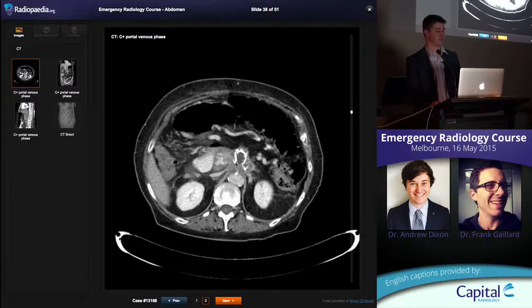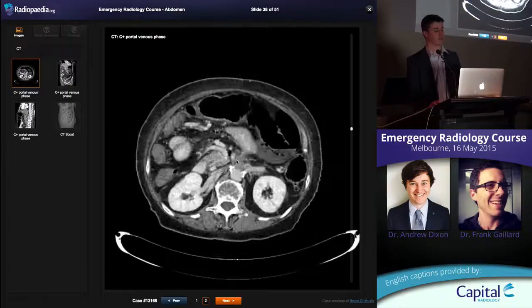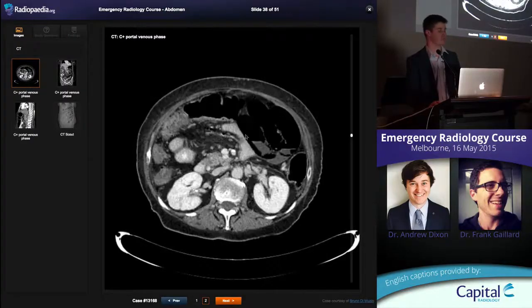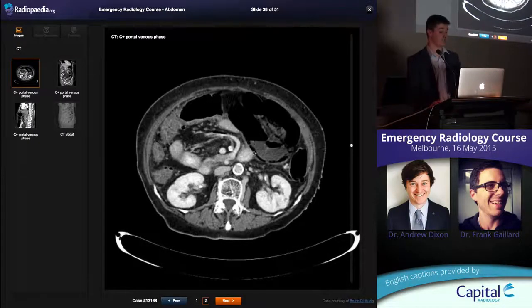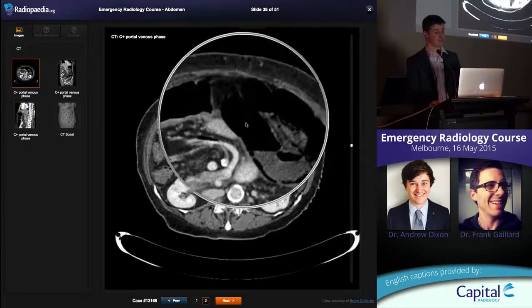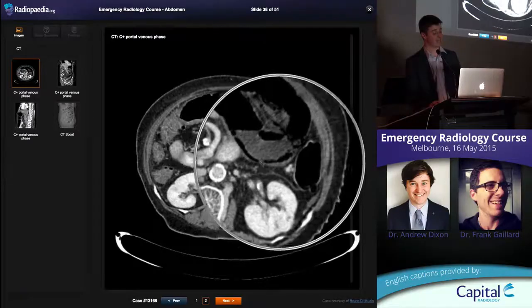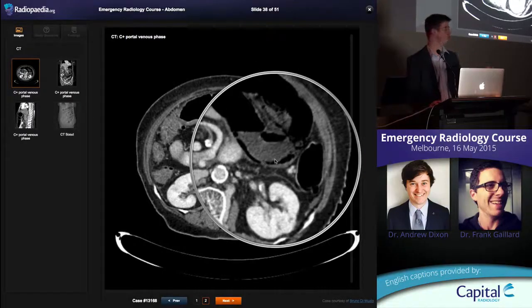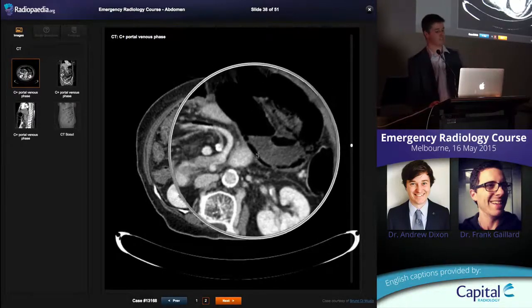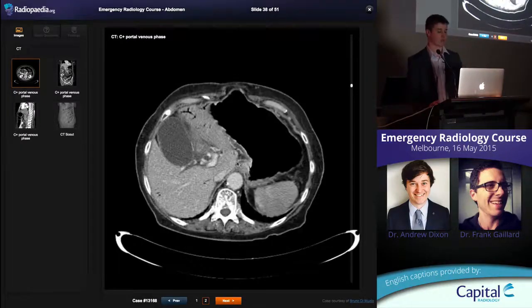This patient's got chronic disease going on here, the past history of pancreatic cancer, all this tumour engulfing their superior mesenteric vessels, okay, causing the ischemia. The bowel is non-enhancing, okay. Gas within the wall of the bowel, see that gas sitting there? You're allowed to have gas that sits antidependently, but this gas sitting down the bottom, beneath the fluid, shouldn't happen. It should always track up. So that's gas within the bowel wall, intramural gas, pneumatosis, okay.